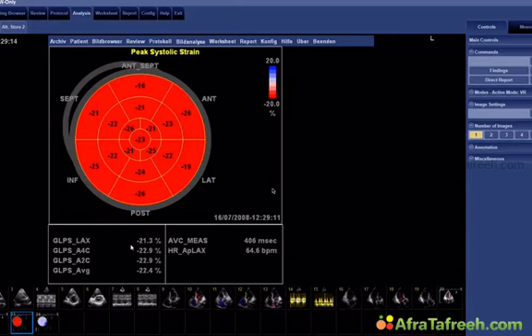So there seems to be some degree of variation. It might also be due to the fact that the patients might very often also have high blood pressures, and this high blood pressure tends to kind of bulge out the left ventricle at the apex. This is just a suspicion that I might have, but to tell you the truth, I do not have the exact answer why this is so. It's just that the typical feature is that of apical ballooning or the shape of a takotsubo.